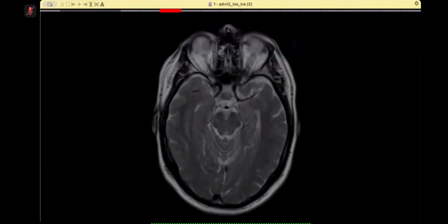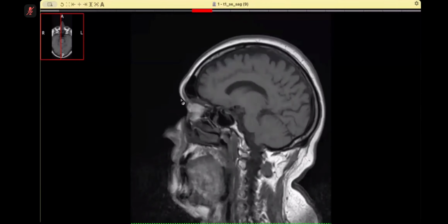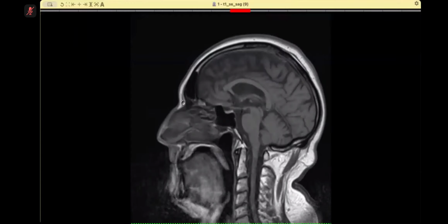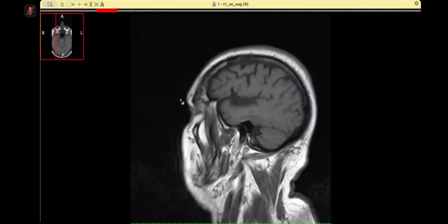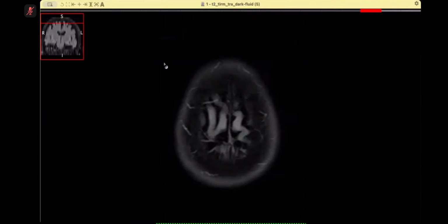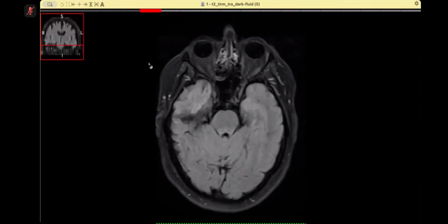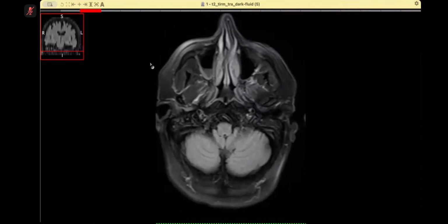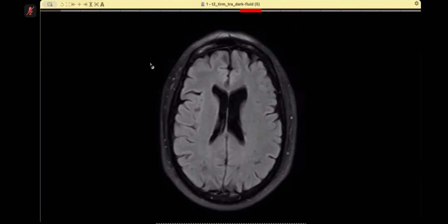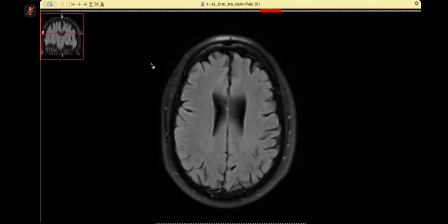I've got a sagittal T1, but just to make a point, I'm showing you a sagittal T1. It appears grossly normal, and there is no evidence of any hemorrhage. What else would you like to see? Let me show you FLAIR. Here you are. The FLAIR images show a few millimetric low signal intensity areas in the brain stem and the centrum semiovale on the left side as well.